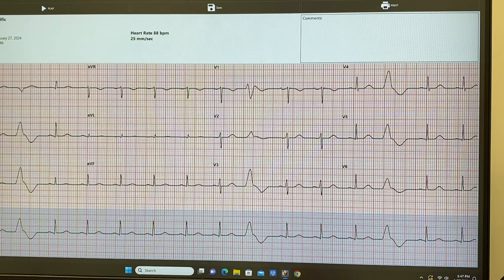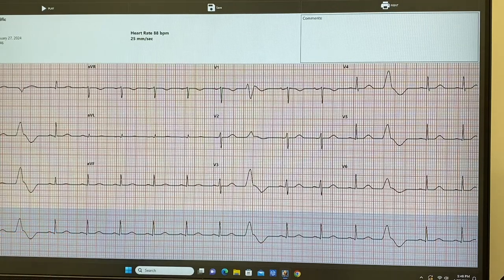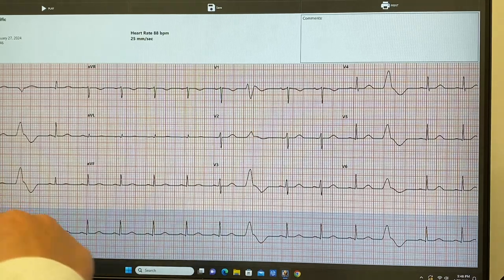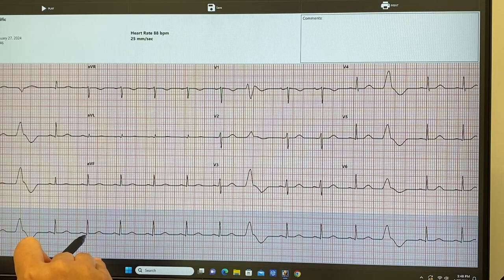The QRS, or so when these occur, I don't see a P wave before. Okay, but when do they occur? So maybe try this. Measure it from the Q's. So pick a Q to Q first. That is normal. From here? No, the normal ones. Here to here? Yeah.